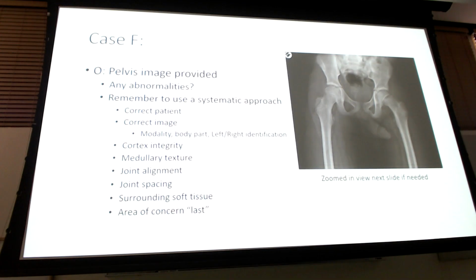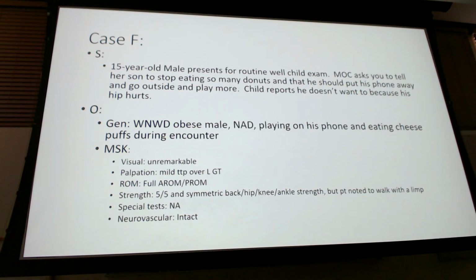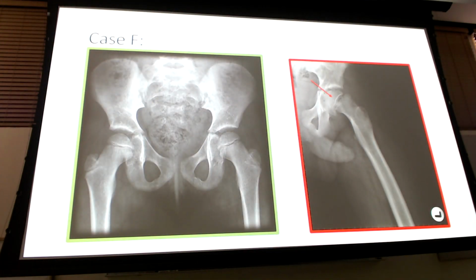How do I know it's peds? Well, I told you it's a 15-year-old. Okay, that's step one. Step two is a Salter-Harris question. It's peds. But on top of this, we're all adults here. Can we tell that these x-rays, even though one is normal and one is abnormal, that one's female and one's male?